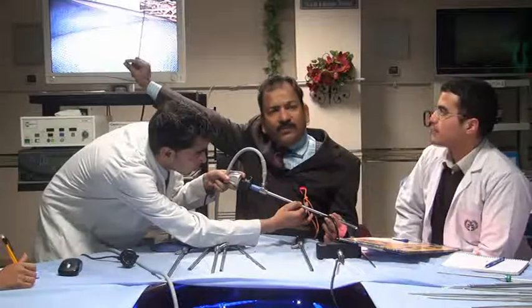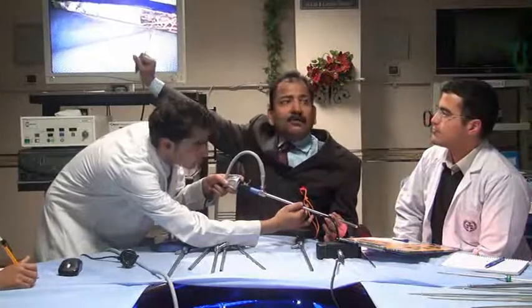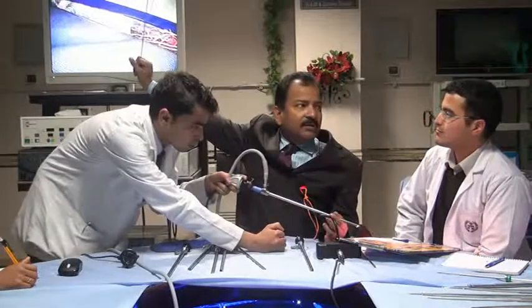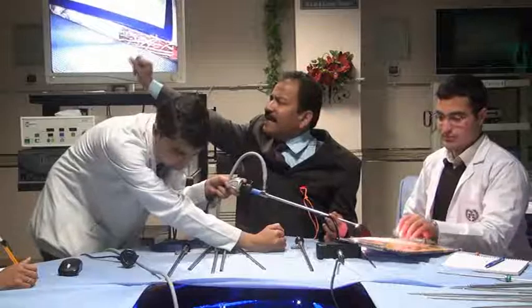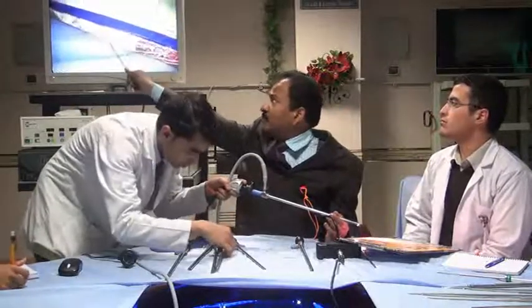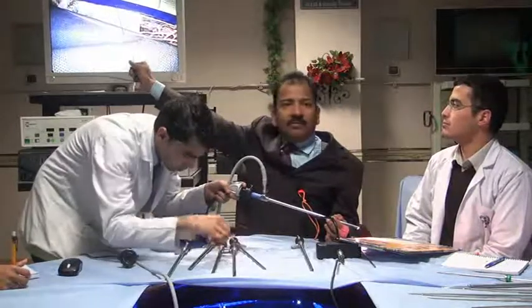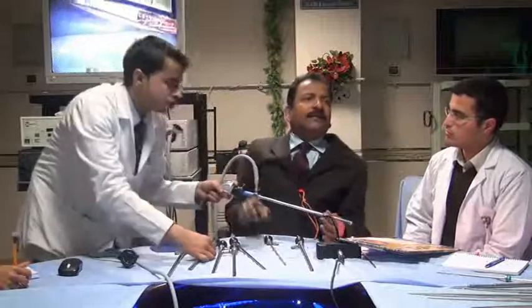You don't have to purposefully think, okay, let me see where is the shadow, okay, this is shadow. Your brain knows that, because our brain is trained for shadow from birth. So you don't have to think, okay, this is shadow, so it is 2 centimeters. No. It will calculate automatically.